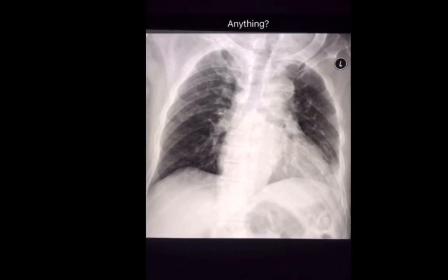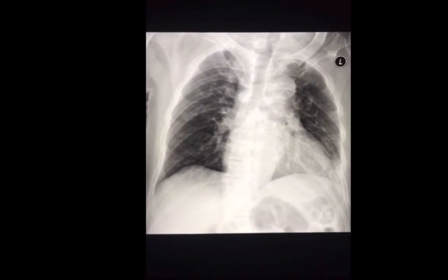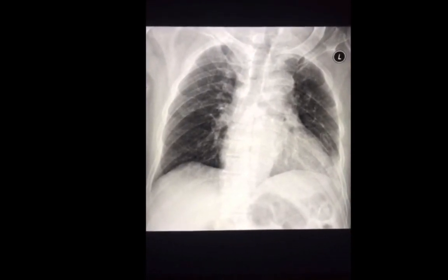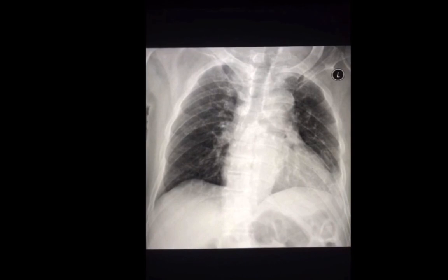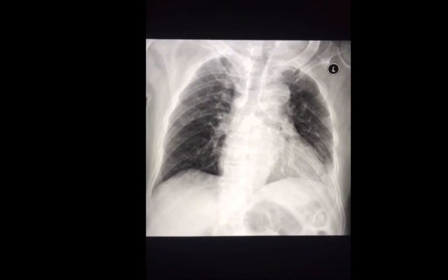Now, since the patient fell down, you should treat this as a trauma case. Have you noticed anything? There are several things that you could look for on a trauma case. This is showing one of them, which is actually a bone abnormality. In many ways, bones are considered hidden areas on a chest radiograph. That's why you have to look at them carefully. Knowing that, have you seen the finding?